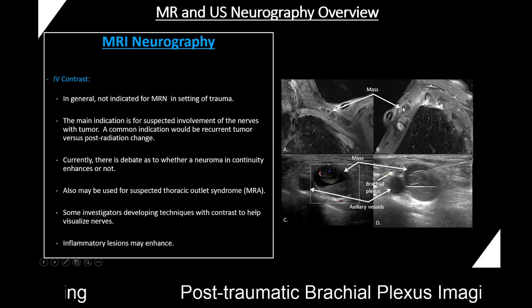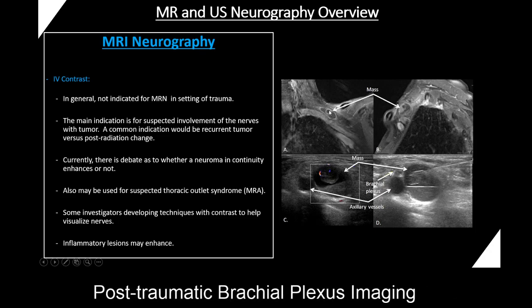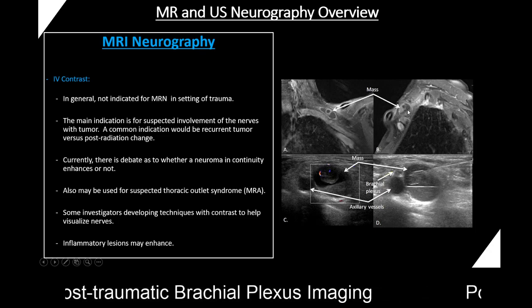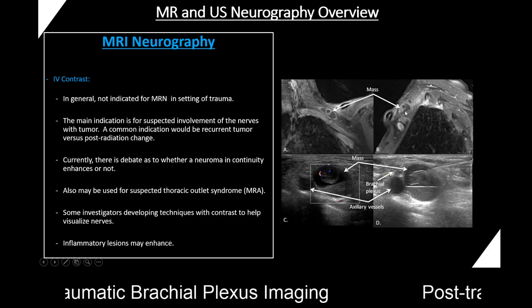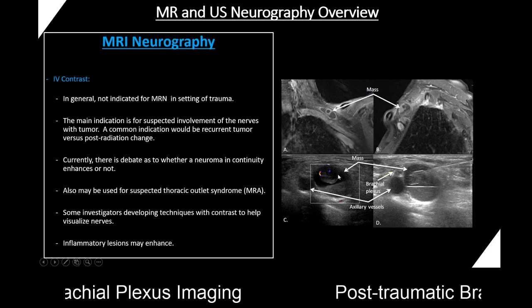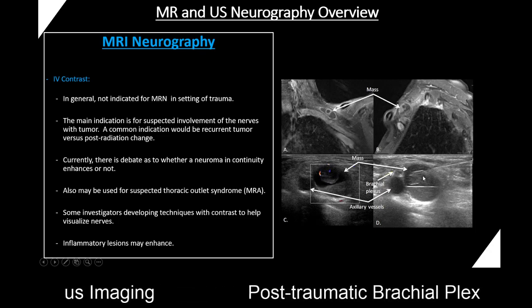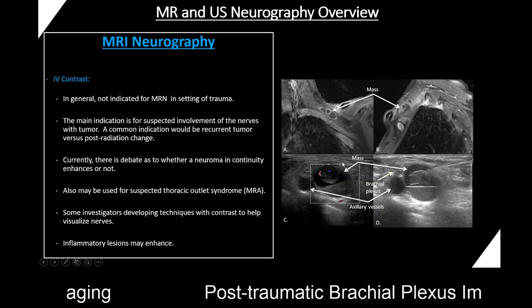We turn sagittal on it, and you can see in the post-contrast there's some enhancement within this smaller cyst, and you can almost make out a fluid level right there. The ultrasound, again, better resolution, shows that fluid level in the dominant cyst, and in the smaller cyst we see internal flow. This was biopsied and proven to be recurrent synovial sarcoma.